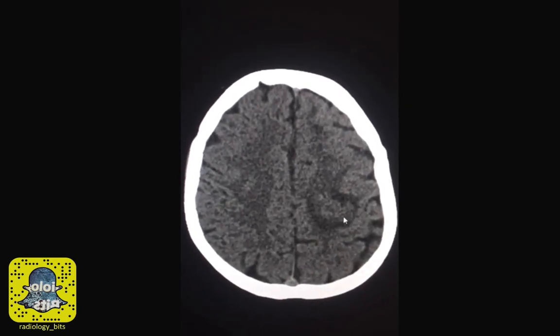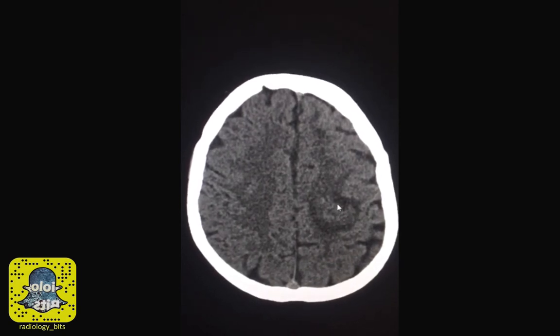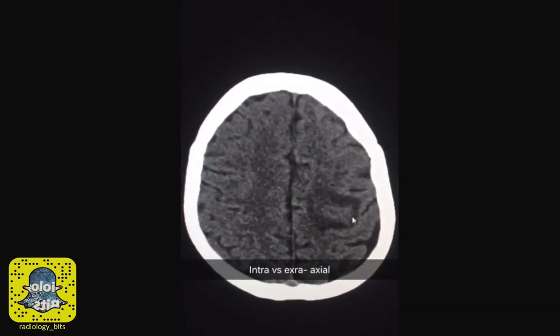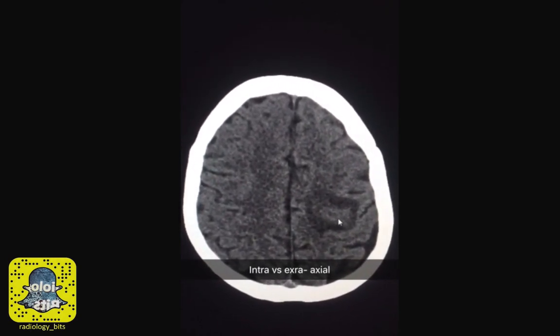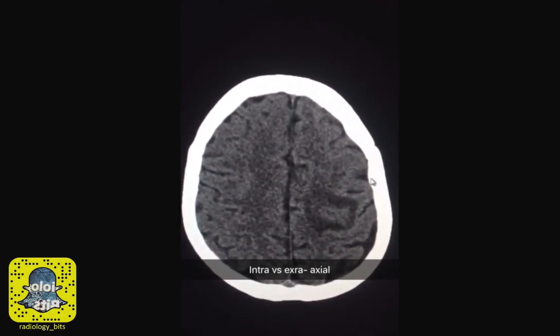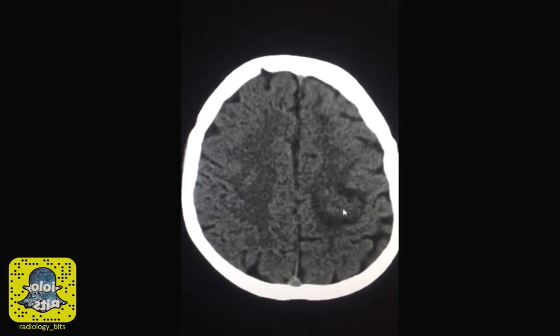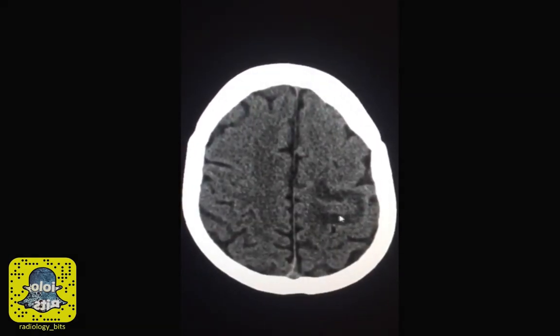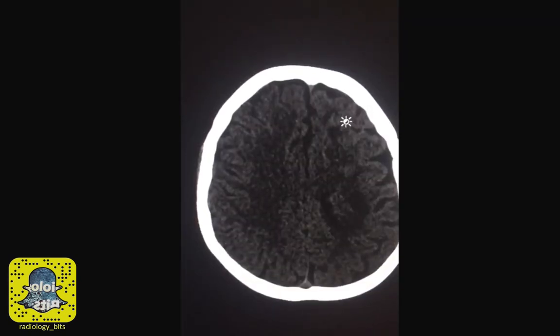Hemorrhage is less likely, especially in the acute phase, since acute hemorrhage would appear bright. It's not the case here. Another concept that we talked about is lesions within the brain are intraaxial, lesions within the skull but outside the brain are extraaxial. And this lesion here is clearly centered within the brain and has other features that go with an intraaxial abnormality. So this is inside the brain parenchyma.